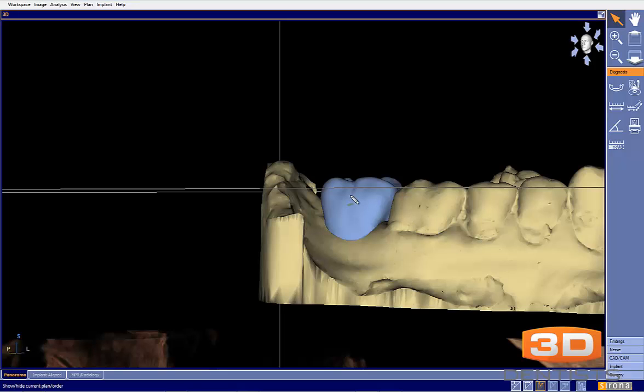So again, in looking at our buccal margin, what I like to do is, if we look here, here's our gingival margin, and then we have a dip down. So in an ideal perfect world, we would have drawn our margin along this line right here, okay? And I'll point out in the planning phase why that's important. We don't want that tooth to come out this deep when we make our final restoration. And the truth is, you probably wouldn't make your final restoration like that. But that margin position, as you know from our workshop training, does affect our implant position.